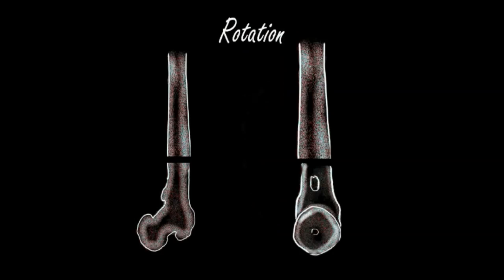It may be that as a result of the fracture, the overall length of the bone has shortened. So in this example, we have a transverse fracture of this particular bone. It looks like a femur, which I've drawn, however the overall length has been shortened. A classical fracture which gives you a shortened bone is a neck of femur fracture, in which a patient would have a leg which is shortened and externally rotated.